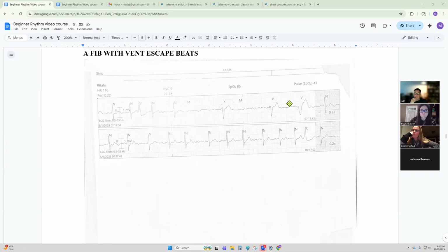These right here, what you call ventricle escape beats. The junctional didn't pick up the slack. And first of all, it's AFib, so there's not really an opportunity for an atrial escape beat, because the atrial chamber is just in a massive muscle spasm. The junctional area didn't pick up the slack, so that heart rate drops. You can see the R spreading out, and then that wide QRS complex comes in. And that's what you call an escape beat. This one just happens to be a ventricle escape beat because you have that bigger, wider QRS complex versus these guys over here.